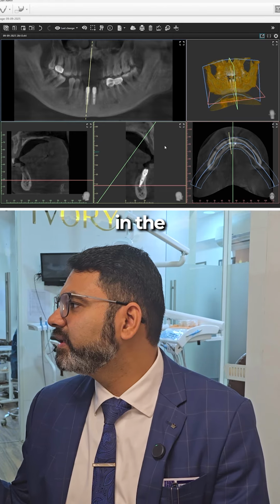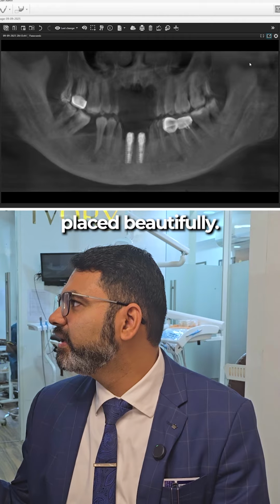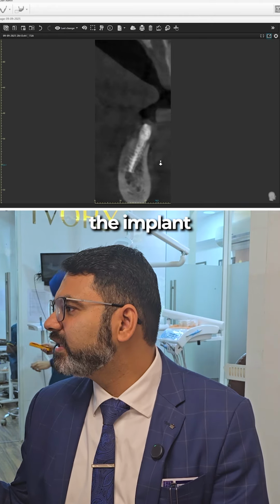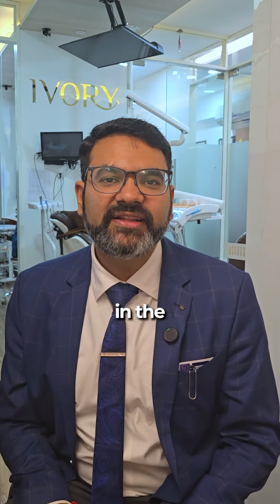And let me show you in the sagittal section, in the OPG section, these are the two implants which are completely parallel to each other, placed beautifully. Immediately after the extraction is done, we have been able to place the implant in the exact angle as was planned. So this is the great benefit of having CBCT in the clinic itself.